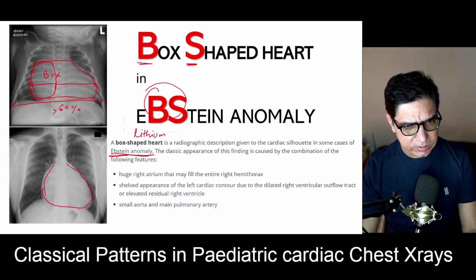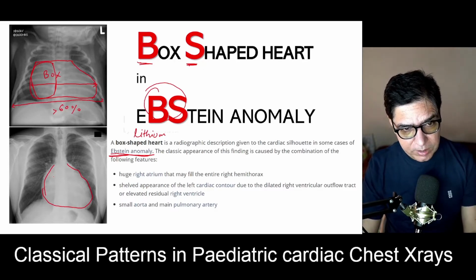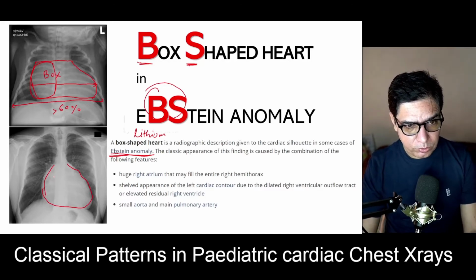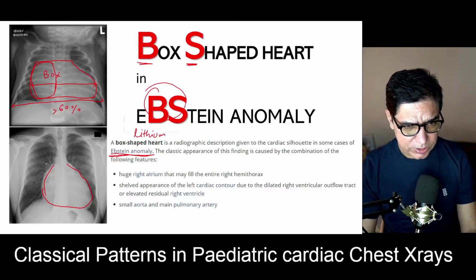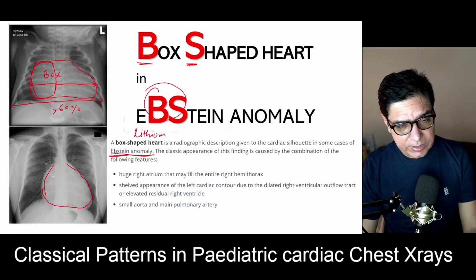But again, as I said, these are chest X-rays. Chest X-rays are never read in isolation unless you have been given it as a spot diagnosis in an exam. In normal practice, you would always have the patient in front of you. You have the history, you have your physical examination. By this time you have done your chest examination. You know what type of murmurs are there, what the history has been, what the O2 sats are, and if there were any clinchers in the antenatal history.